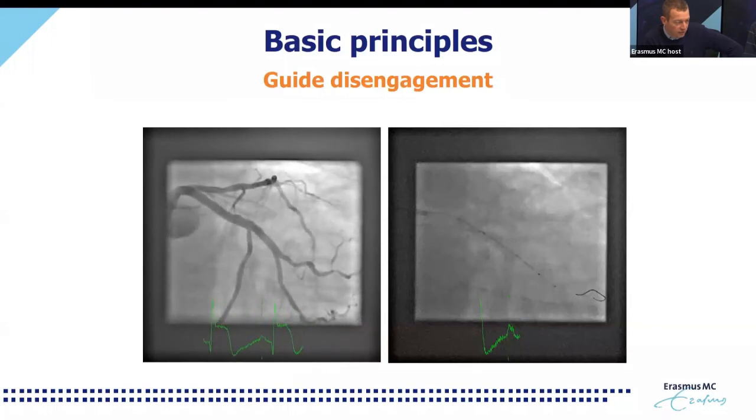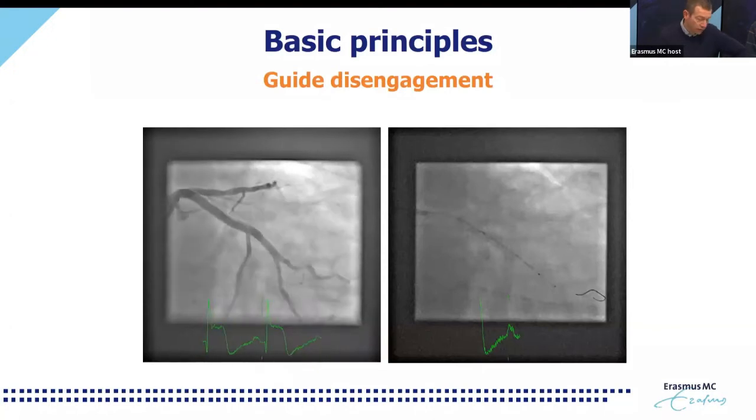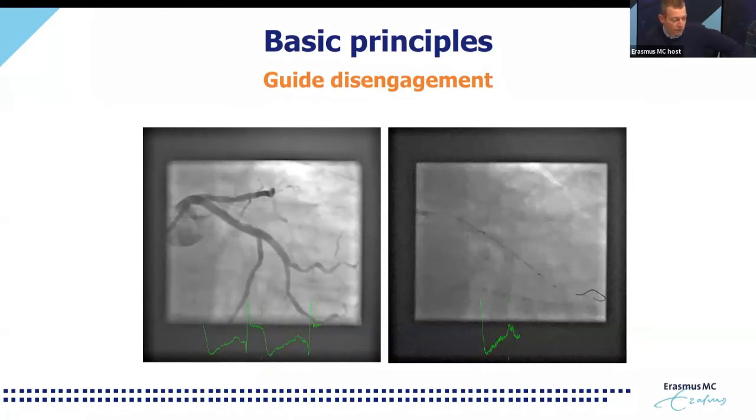Please make use of this and image the full vessel, including the ostium, which in some cases might lead to very interesting information, as we will share with you in several cases we have prepared for you today.